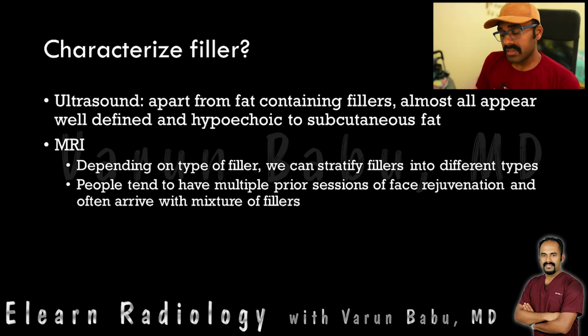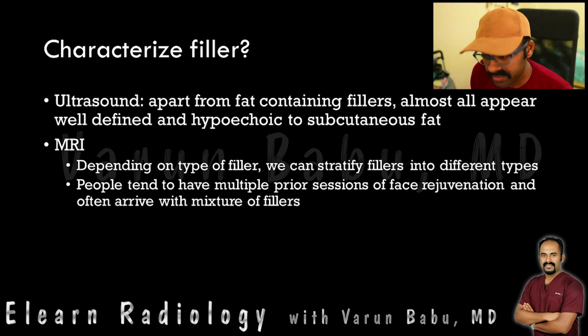In ultrasound, quite often the fillers are seen to be well defined, hypoechoic to the subcutaneous fat, apart from fat containing fillers which tend to be isoechoic to the subcutaneous fat. Ultrasound will only demonstrate a thin, imperceptible wall, and some fillers can have homogeneous echogenic contents within.